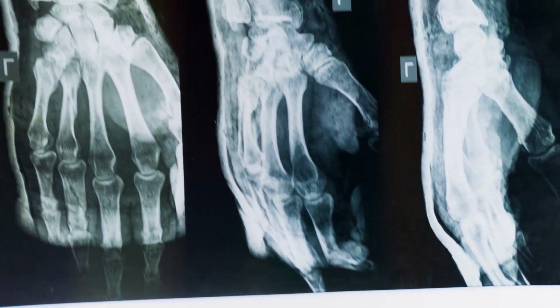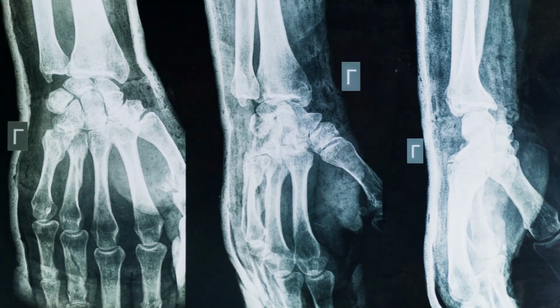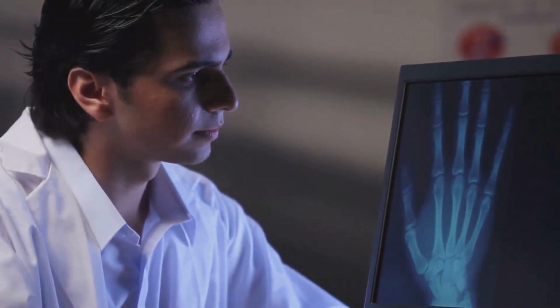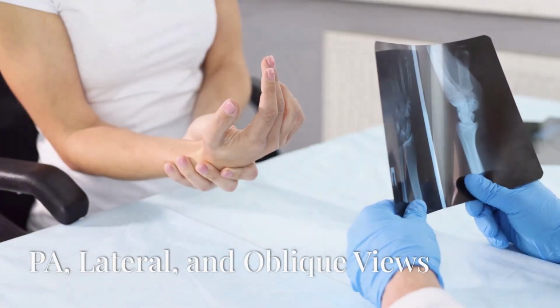Oblique view. This is taken at a 45-degree angle with the hand placed palm down and slightly rotated. Each view gives us different information about the bones and joints. That's why we need all 3 for a complete picture.